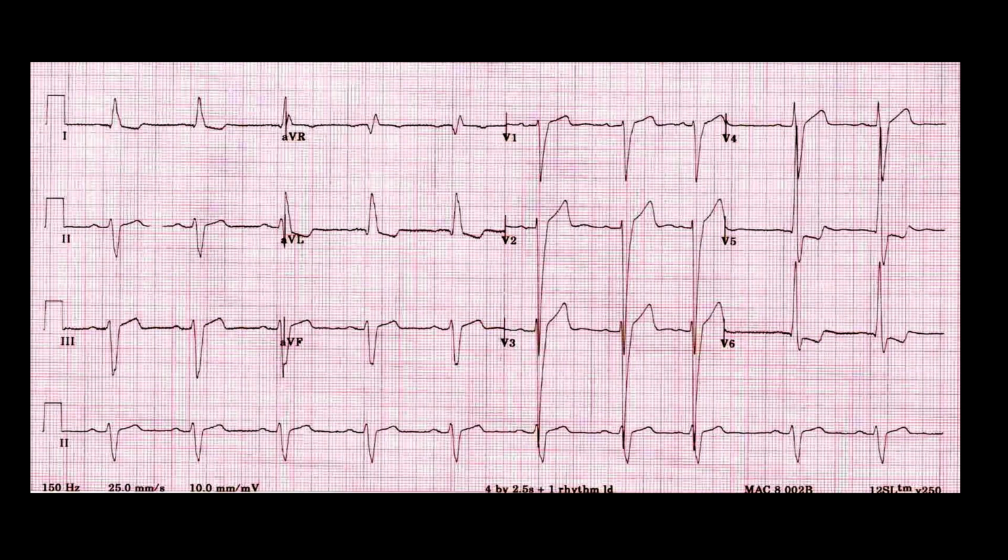First off, my QRS complexes are really big, especially in your precordial leads. So that should key you in right away. It's not that a STEMI can't have big QRSs, but definitely can for sure. But you want to look at this for a second and go, okay, what are we dealing with here? So if I look at where the energy is going in the heart, I've got a left axis. I can tell that because AVL is the most positively deflected QRS in the hexaxial leads.